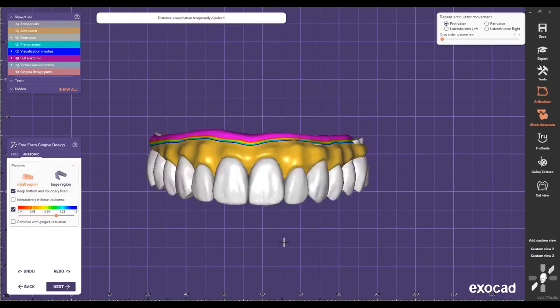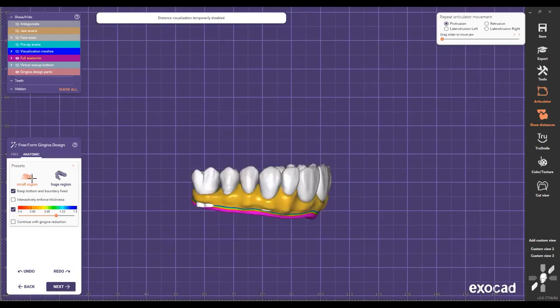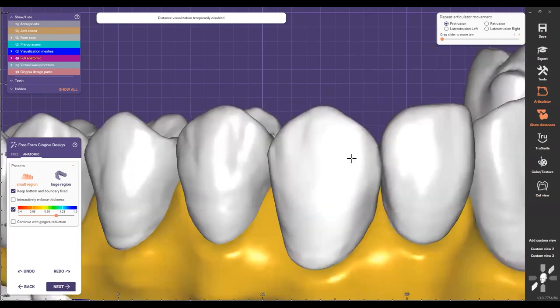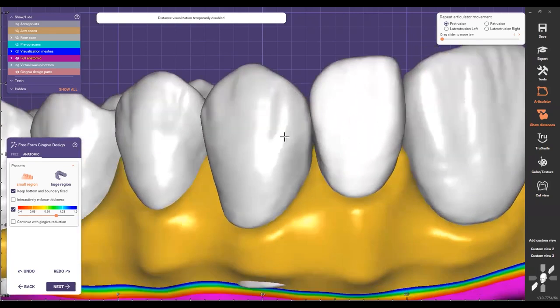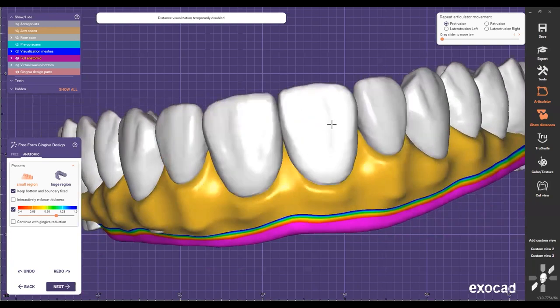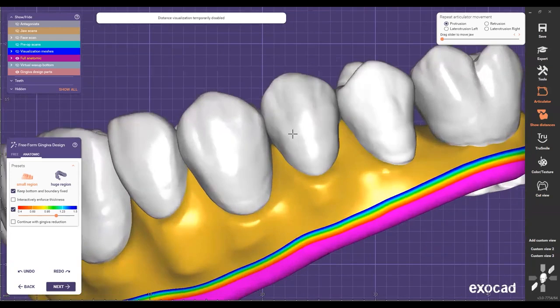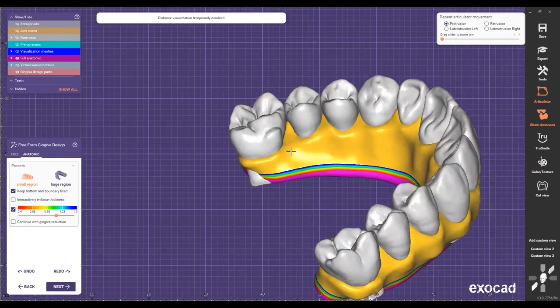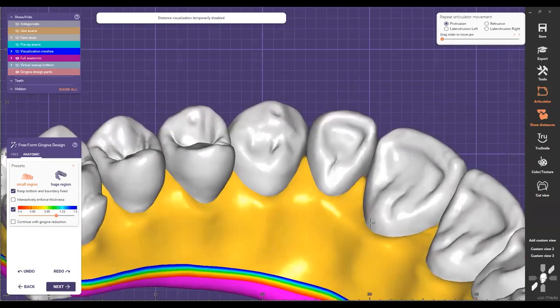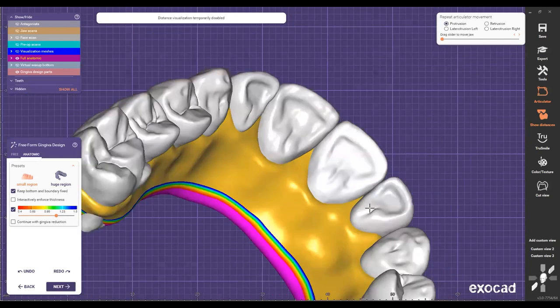Now, from here, the things that I like to do is, when I see this, I have my protocols. I start pulling, so that's how I know what I'm doing every time I'm in this stage. I'm pulling, pulling, pulling, and you can see that I was able to close the surfaces on the teeth in the interproximal area, so my design is not going to show too much papillae, too much pink right there. So now I'm going to go here and start pulling those papillae.